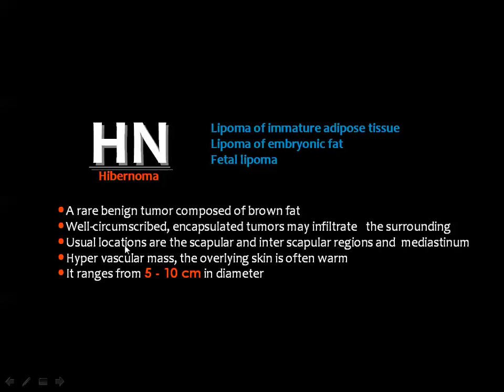Then we came to the hibernoma, which is known as lipoma of the immature adipose tissue, or lipoma of embryonic fat, or fetal lipoma. You see that this lipoma will arise from the brown fat, or the fat of the fetus, and it will appear almost exactly similar to the lipoma, except in some differences.